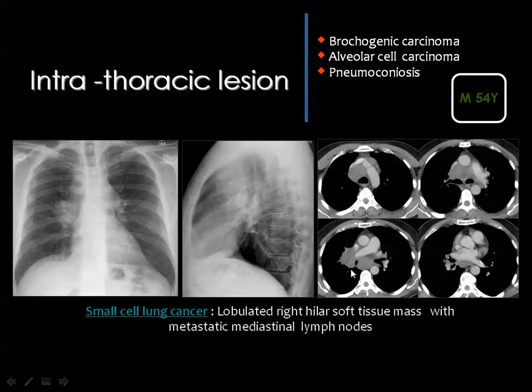Then whenever you know the primary malignancy, or you see the primary malignancy in the images, and you consider the lymph nodes as metastatic, one may say that you have said that metastatic lymph nodes show necrotic center, and this is not always an imaging finding. Metastatic lymph nodes may be homogeneous, may show necrotic centers, but commonly metastatic lymph nodes, because of the malignancy, they show areas of central breakdown and necrosis. Then how can you know that these lymph nodes are metastatic? Because you see the primary malignancy.